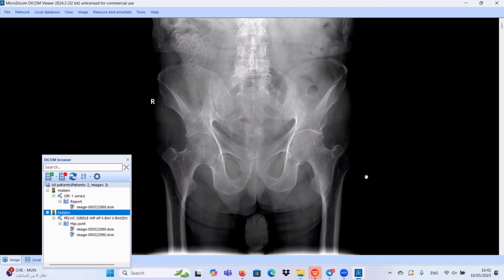However, I can't see the right femur very well. The sacral arches and the sacral foramina are also intact, and the pubic symphysis is also normal. There are maybe rectal gas shadows noted. So I am thinking of unilateral sacroiliitis, and I would like to correlate it with MR and the patient's history of any infection, IV drug abuse or HIV.